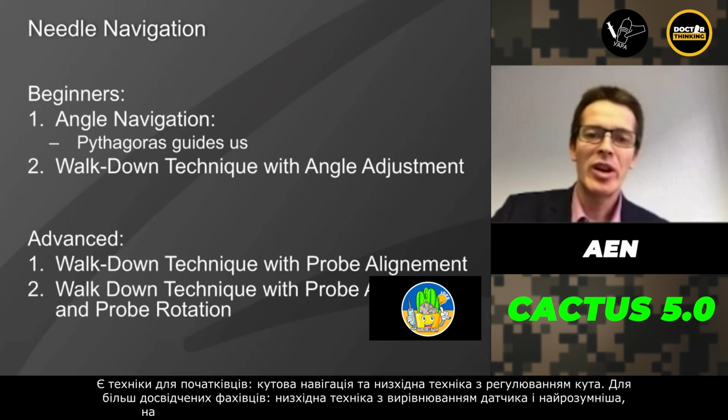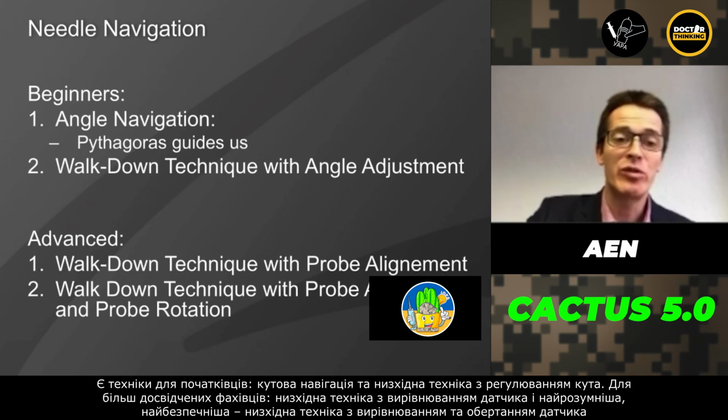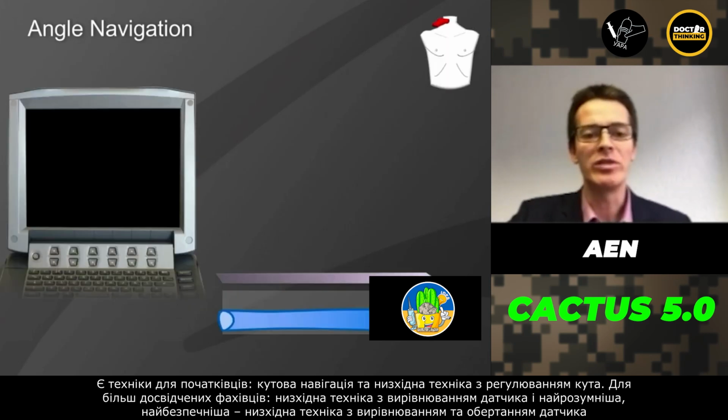We have divided these methods into those for beginners: angle navigation and a walk-down technique with angle adjustment. For more advanced users, the walk-down technique with probe alignment. And at the end, the smartest and, as we believe, the safest technique is the walk-down technique with probe alignment and probe rotation. So let's go over this.